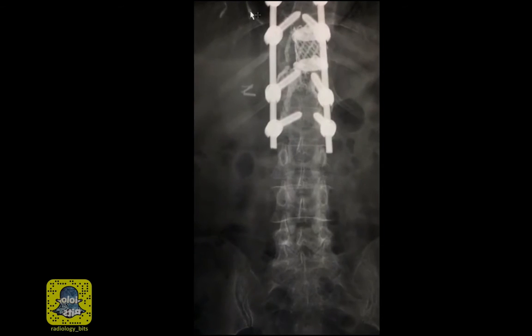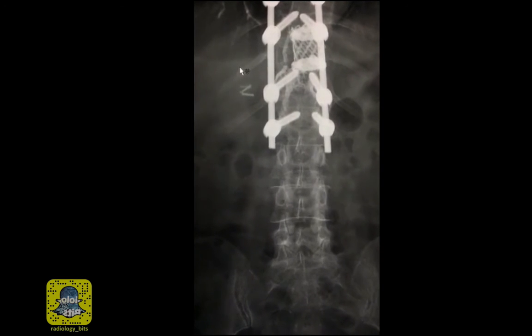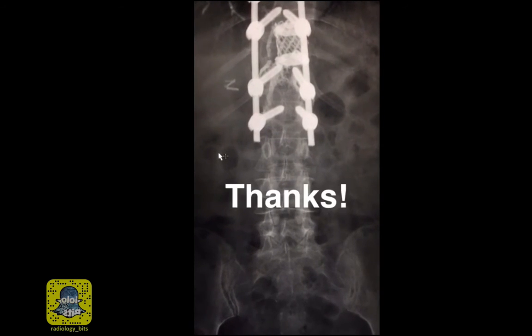So whenever you see very dense tubular material within the lung that could be within the vessels, think about that entity. That's it for today's quick case.